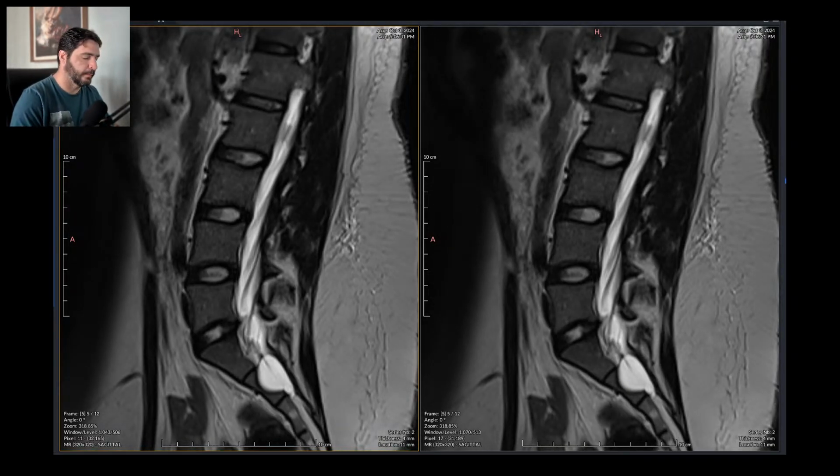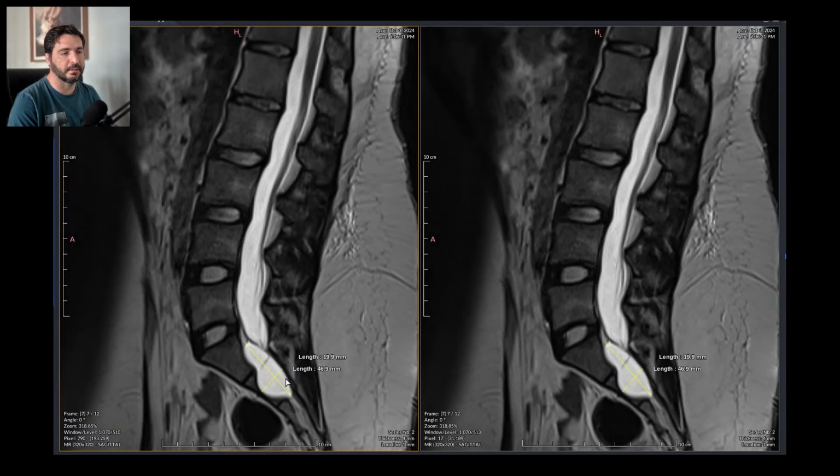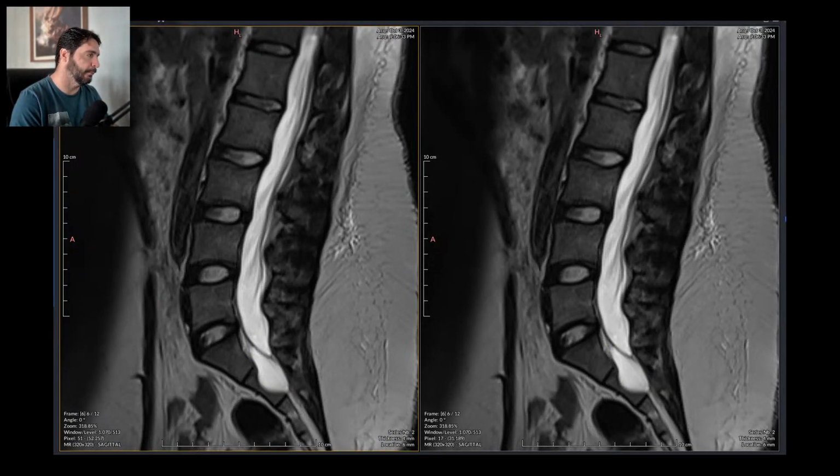So let's go for arthrosis, synovitis, and slight edema, and this meningeal cyst right there, and we should be good to go to the next exam. I will also have hypertrophy of the perivertebral muscles. And I have to describe the cyst.